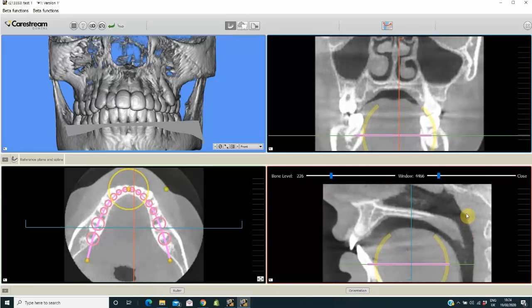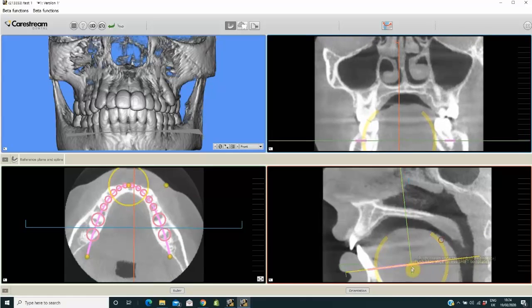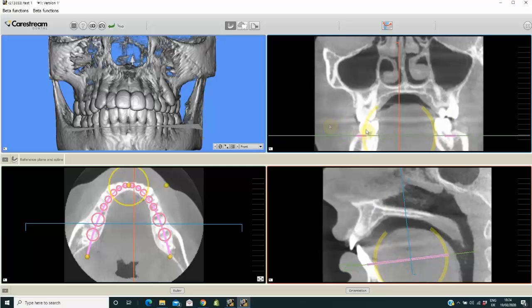change the contrast. If you need to adjust the brackets or slices, you can tilt the slice slightly using your mouse. Use the three windows with these brackets to tilt, rotate, and move the shape of the line. Use the yellow points to change the shape of the curvature, to stretch the line, or to make it wider.